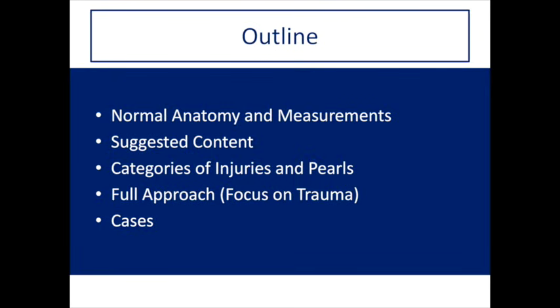If you're a resident at U of T, you're going to see a lot of traumas and look at a lot of C-spines. Previous residents have mentioned that looking at spines is one of the most difficult areas, primarily because findings can be subtle and the consequences of missing something can be huge. So, practicing this full approach will be important.